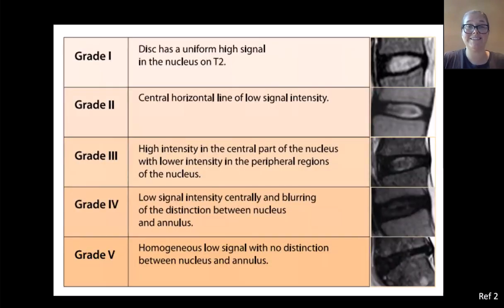Alrighty, disc desiccation. Just like spine trauma from the summer, there are so many grading schemes. I don't want to say it's ridiculous. Obviously, someone has put a lot of work into this, but I think it's good to be aware that there are sometimes grading schemes, but also to be aware that in practicality, you're probably not going to use them.